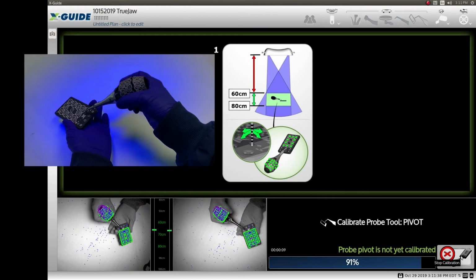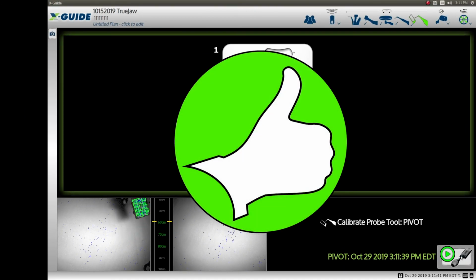Once calibration is completed, you are now ready to proceed to X-Mark registration.